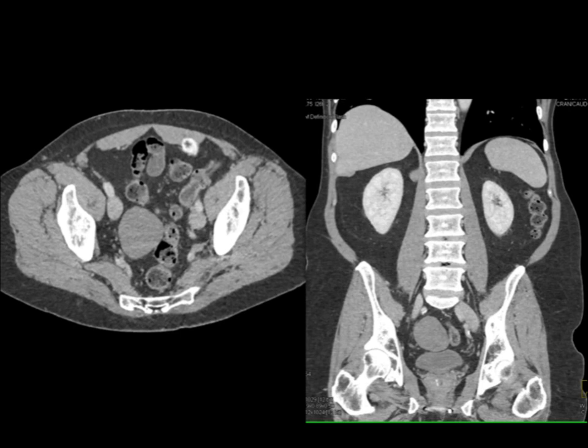It's smooth, it's a mass, it could be a desmoid tumor, it could be a GIST tumor, it could be leiomyoma, it could be a lot of smooth muscle things, could be large nodes, could be a pheochromocytoma perhaps, though not a great location. Well, this patient went to surgery, and this was a leiomyoma.